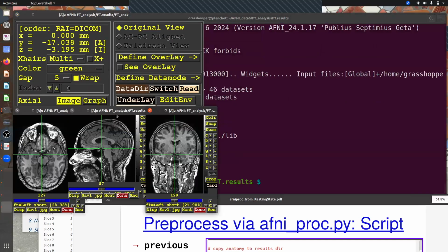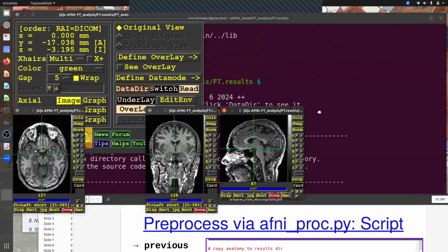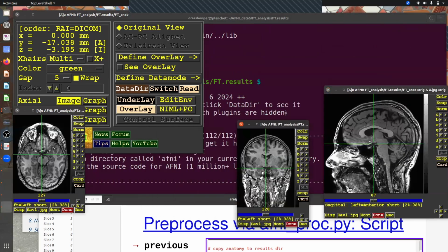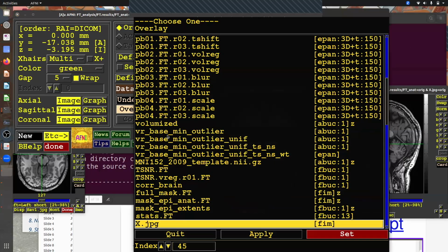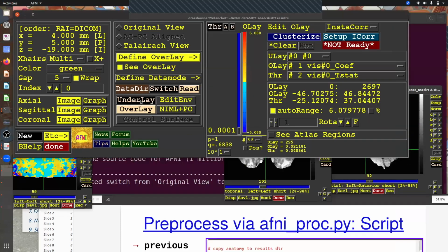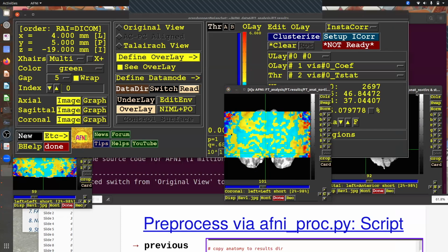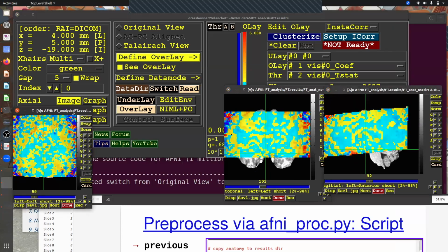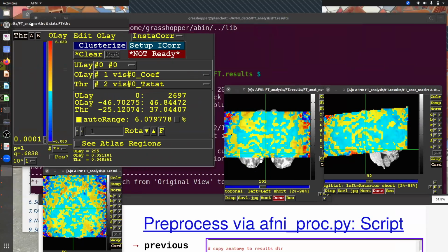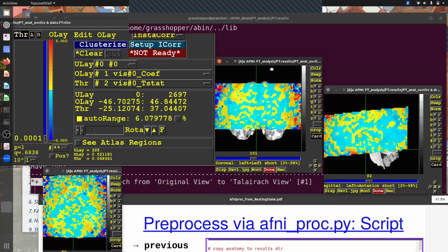Open here. So at the end of the day, you can look at things and you can kind of jump to, for example, the statistical map here. Bring it to the forefront. So I'm just going to jump to the results for a second to see what we're getting at.